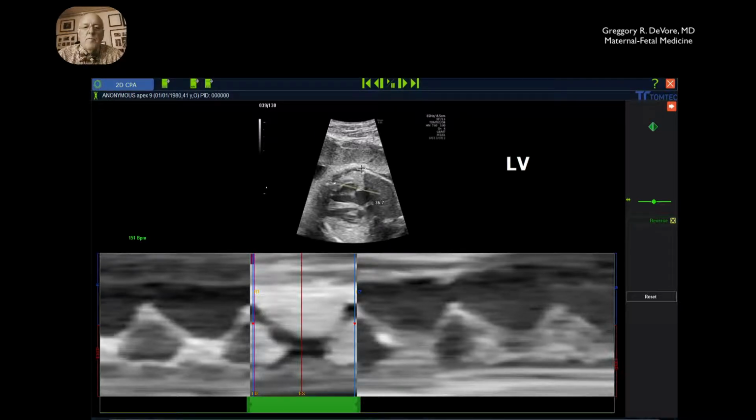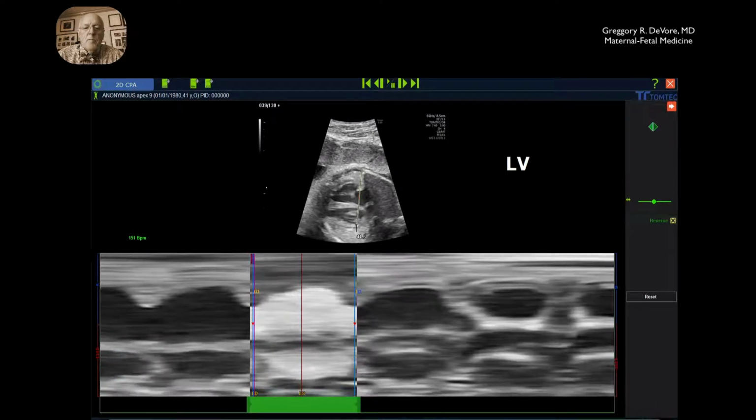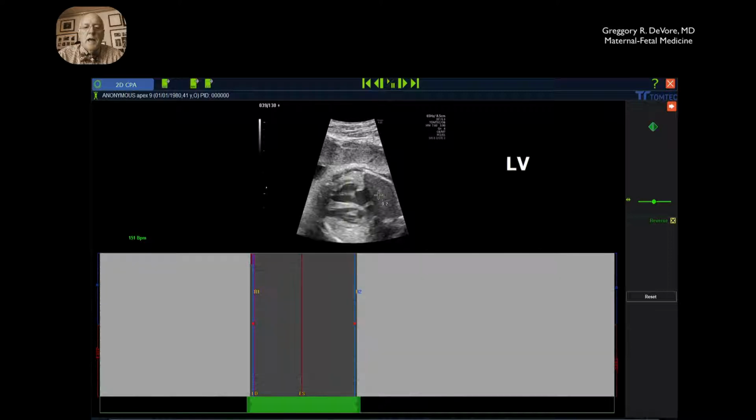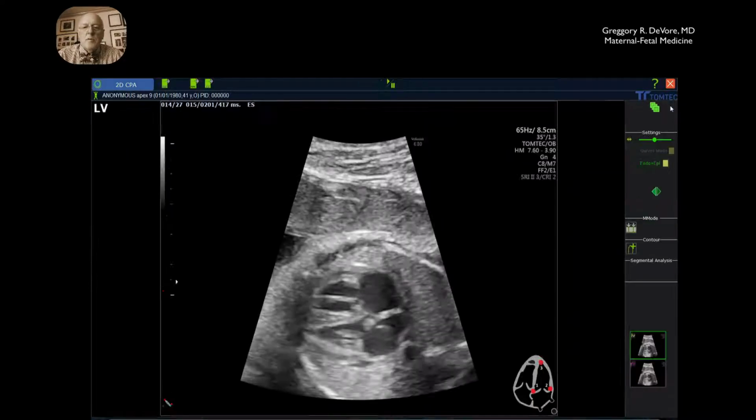Now again, if I place the cursor here, you can see the different M-mode representations. Here it's through the atrial chambers, and in diastole, using the atrial systolic waveform would look like this, or the ventricles would look like so, and again the annulus like so. So we have several choices we can take and use for defining our cardiac cycle. Now we click next. This next step, I will identify the left and right ventricular endocardium.